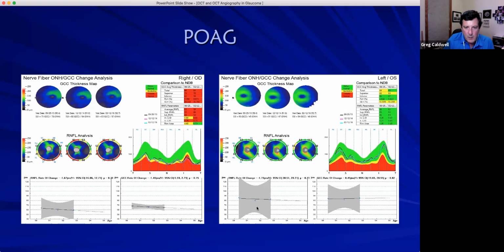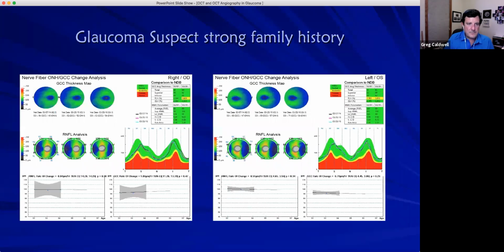This is a pretty wide confidence interval. And even this one's trending upwards. So maybe the technician over time is getting better. Maybe this is a bad scan, as we're seeing here with these black areas. But again, ganglion cells are a little bit easier to scan because they're looking at it with their macula, eccentrically fixating for their optic nerve.